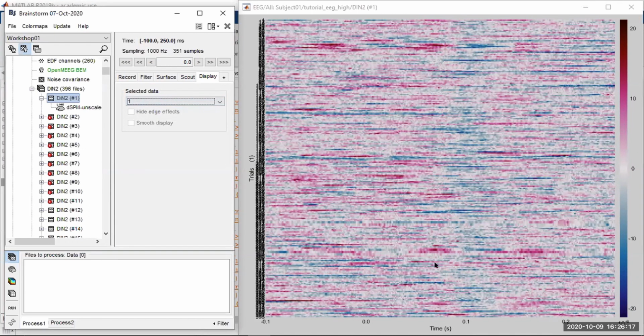So this is just the first channel, and even though when we're looking at individual trials it's very noisy, we can already appreciate that around 100 milliseconds, we have a very clear negative peak of activity, followed by a very clear positive peak of activity. Even though it's not perfect amongst all trials, we do see the trend emerging. So when we do our average, it will be very clear that it will show up in the ERP.